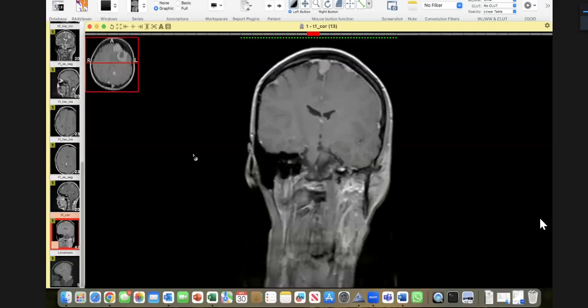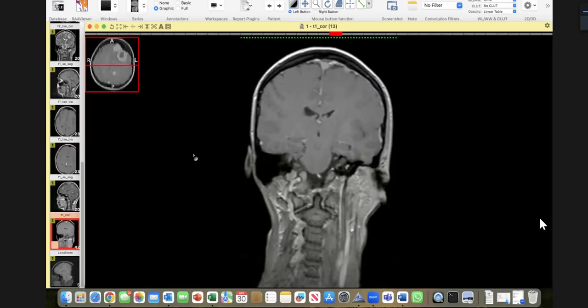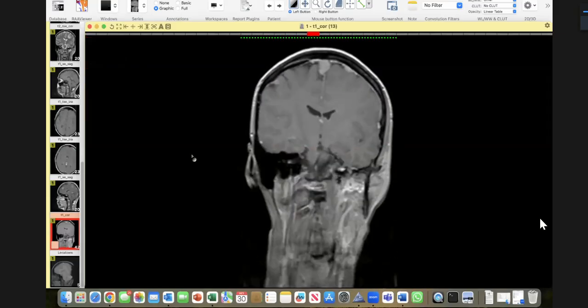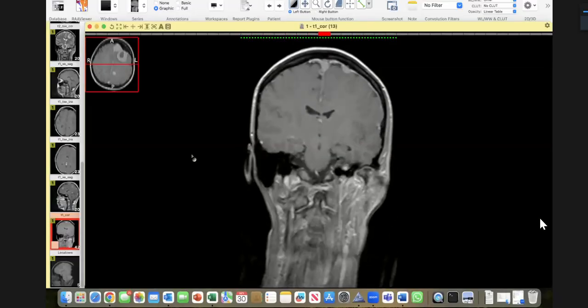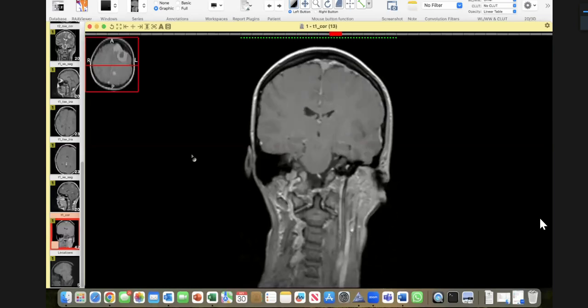I would convey my findings to the referring physician and request them to get a whole neural axis imaging to look for multiplicity of the lesions, including the spinal tumors as well. The patient needs genetic screening, and the further management depends upon the symptoms, because there are multiple, and if the patient is developing any symptom relevant to these larger ones, neurosurgical consult is suggested for that. I could not appreciate any obstruction, no transtentorial herniation, or any signs of acute hydrocephalus.